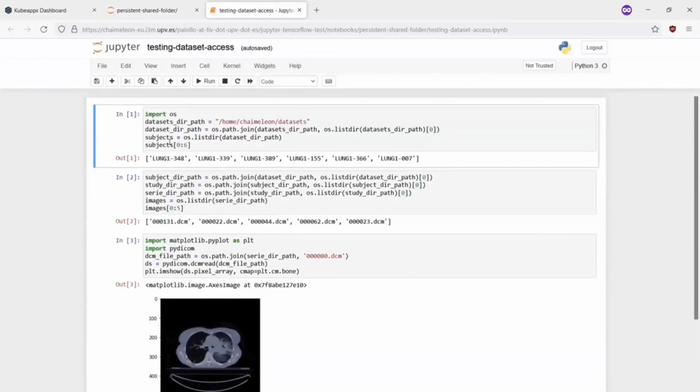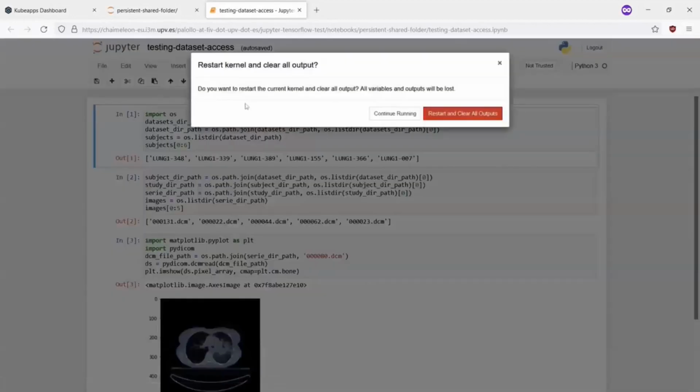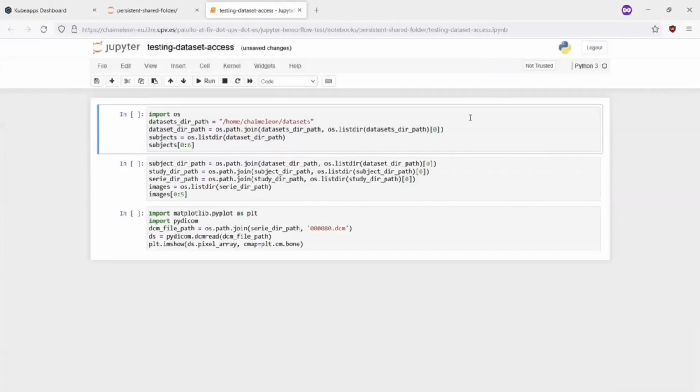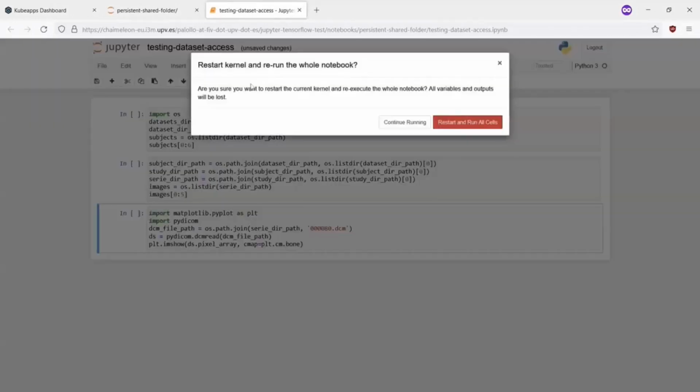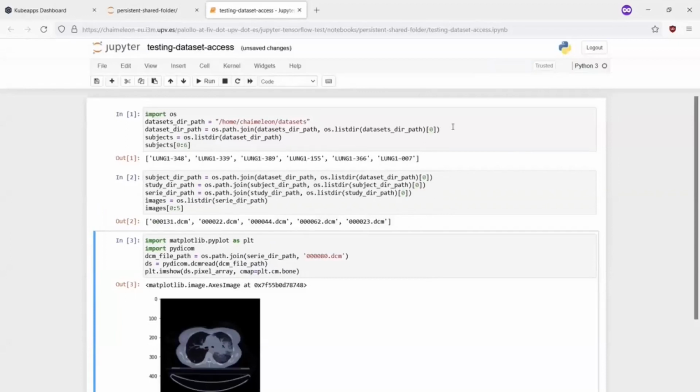So this simple notebook will fetch the data from the directory and visualize it as images on the system. So we can just simply rerun to validate the process. With this very simple example, Pau has been able to access the data in situ without having to download it, and using resources that she couldn't have at her own institution.